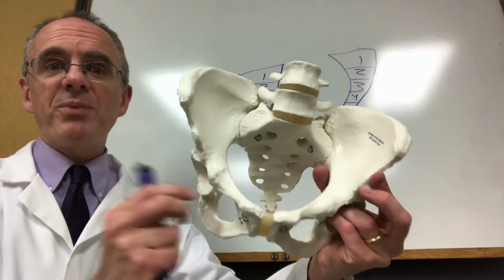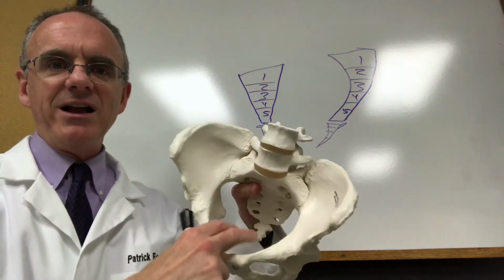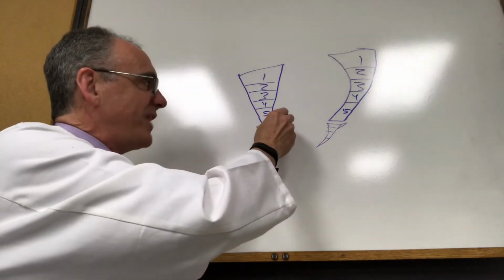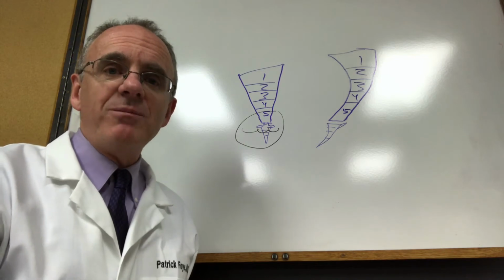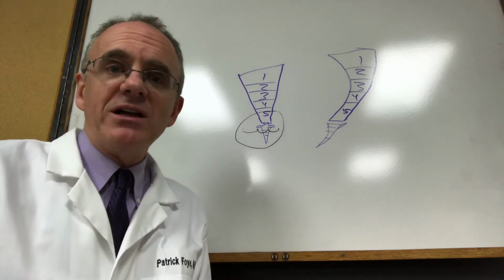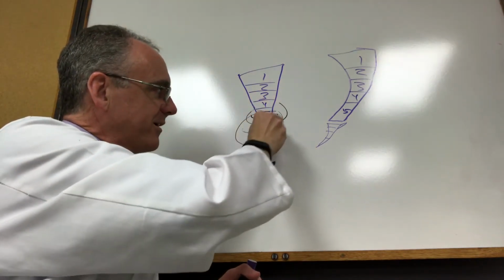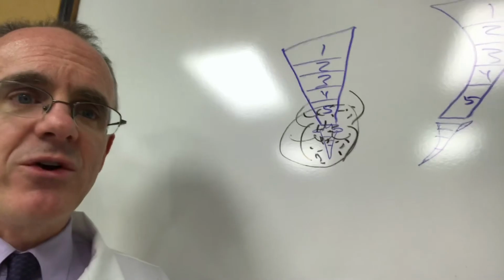Even if they do the tilt, there are still problems with the front view, and I'll show you that here. What's in the front of the pelvis that's going to be in front of the coccyx? Well, there's the urinary bladder, where we collect urine before we pee. So that's going to be up here, and you've got some urine in there, so that's going to block the view. The other thing in front of the tailbone is the uterus in women, and in men and women there's the rectum or colon, the part of the large intestine where stool collects before having a bowel movement. So now you've got your stool collecting in that area, and you can see why you're going to have a tough time on that front view really getting decent detail in your imaging of the coccyx.